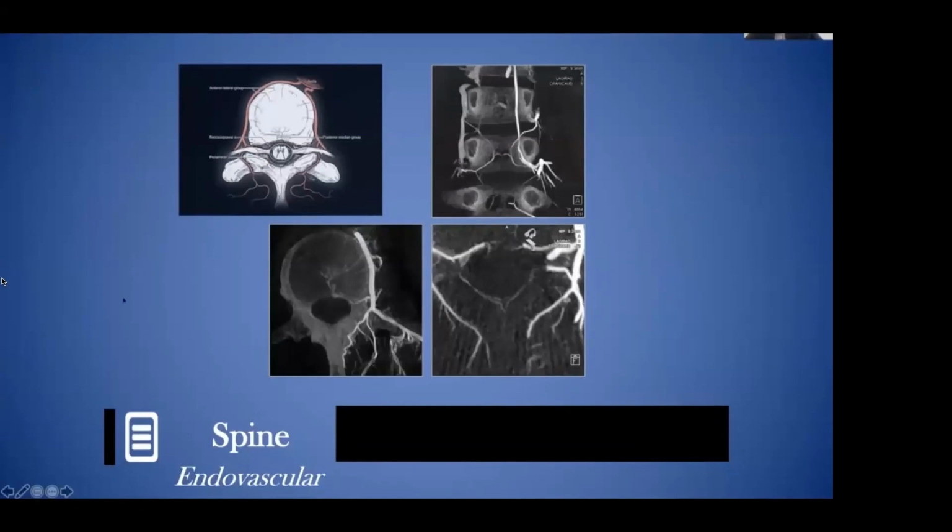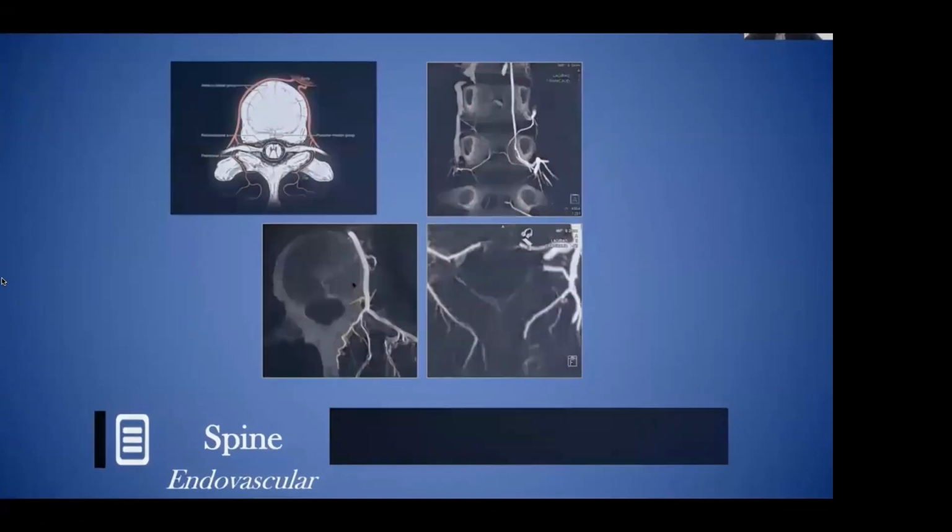sort of vascular work. And this is just depicting the level of detail that we can, first of all, you need to be aware of the individual structures, obviously the vertebral body or the corpus, and the lamina, spinous process, but then that allows you to know that you're dealing with pre-laminar branches and retrocorporal branches, for example. And we depicted these really nicely using Dyna-CT or tomographic CT using angiographic data.